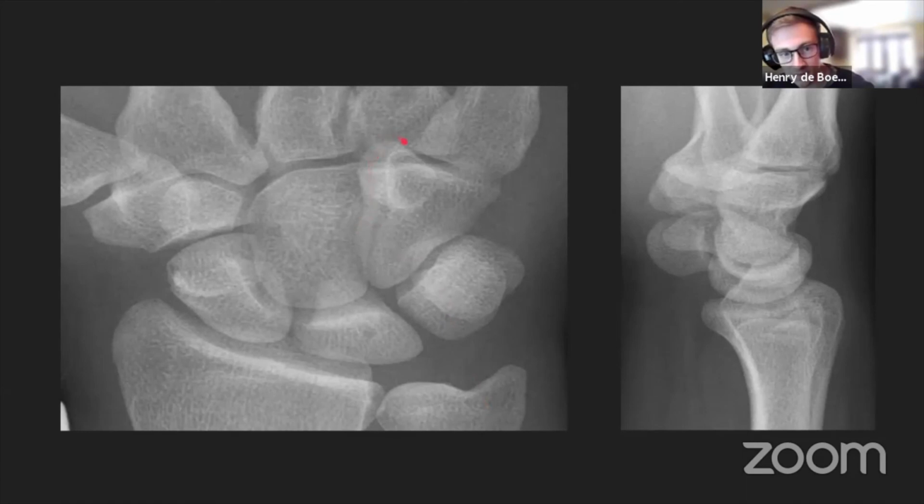So this again, hamate, and this bit here would have been the hook, which you can sort of see how a fracture here might be difficult to spot, and then it's displaced here. Okay, so I'm aware we've run over, so if anyone can quickly put an answer.